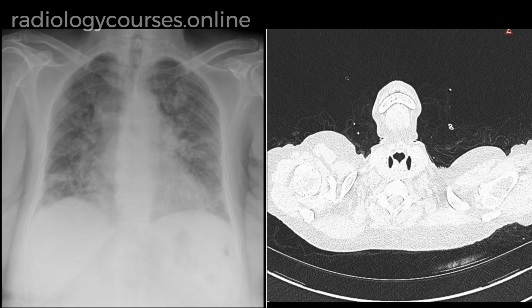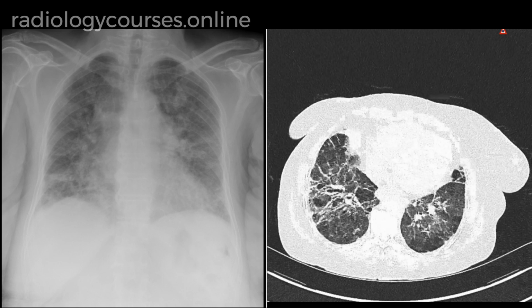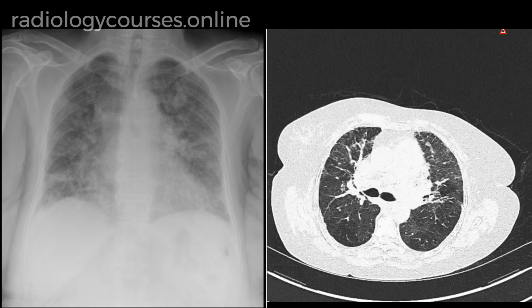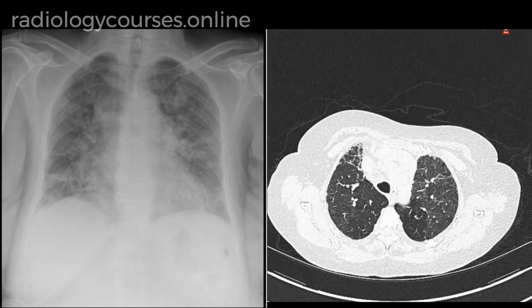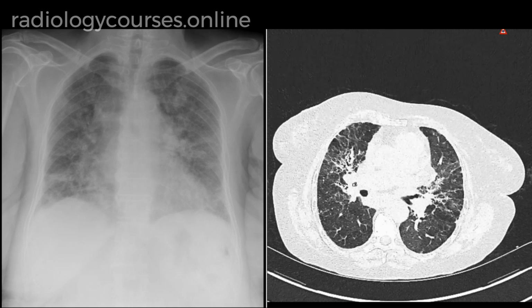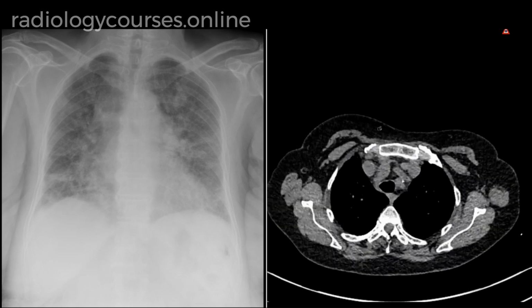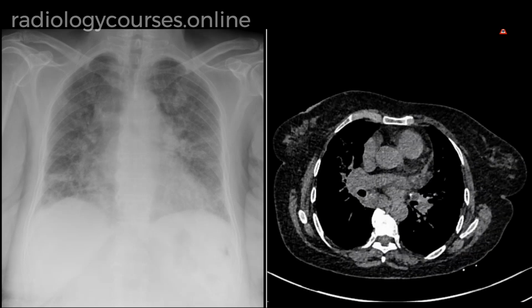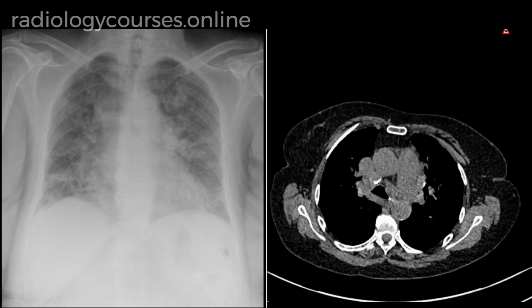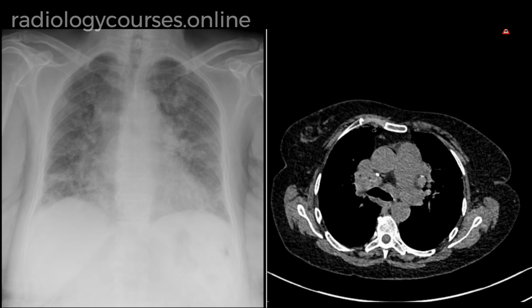When we perform HRCT, the examiner might show the HRCT findings, and you can tell that there is extensive bilateral diffuse thick interlobular septal thickening with extensive ground glass opacity with some mosaic pattern, and also there is bilateral moderate to extensive cicatricial bronchiectasis. On the mediastinal window, there are multiple enlarged, peripherally calcified, fairly symmetrical lymph nodes in the paratracheal regions. Hence, the diagnosis is confirmatory or very characteristic of sarcoidosis.